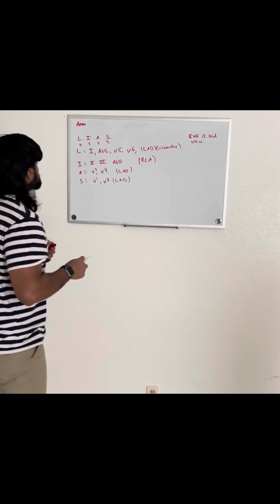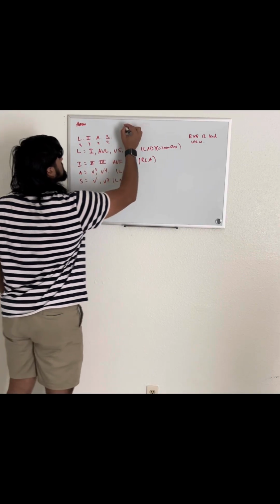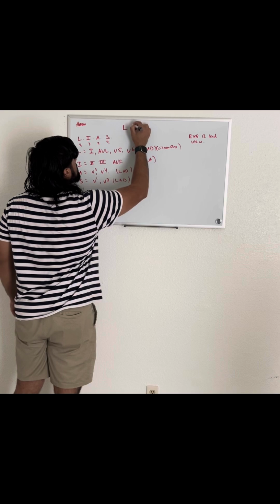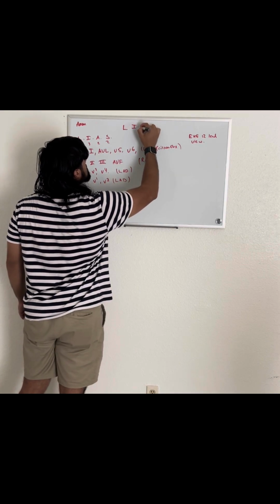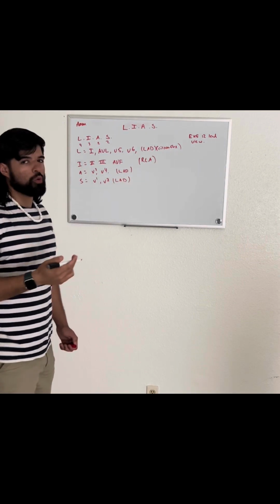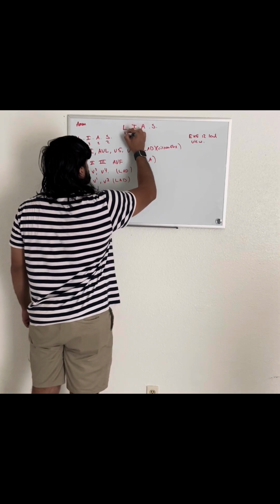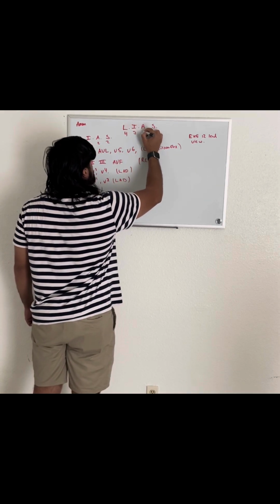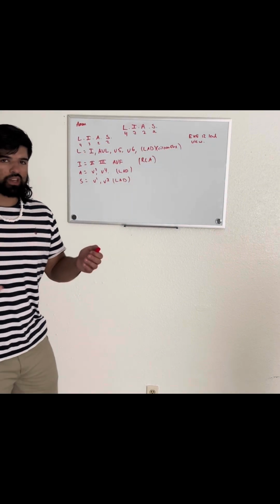So first, I made a mnemonic called LIAS, L-I-A-S. And this is very, very cool. The reason I say it's cool is because whenever we do LIAS, we do 4, 3, 2, 2. So those are going to be the views we're looking at, right?